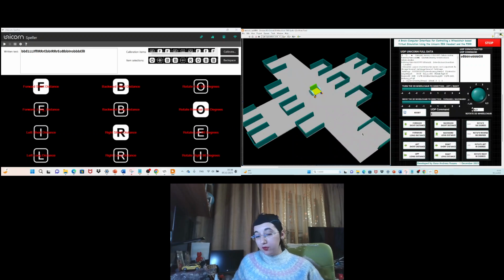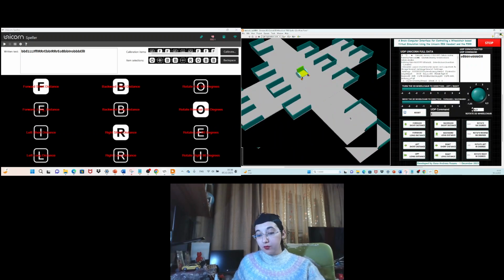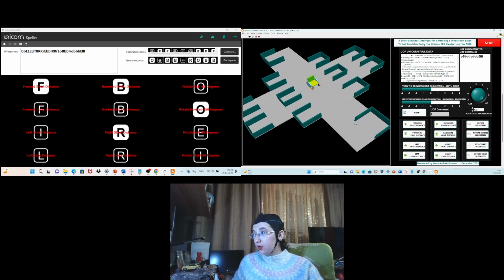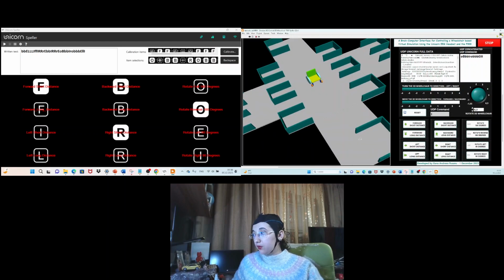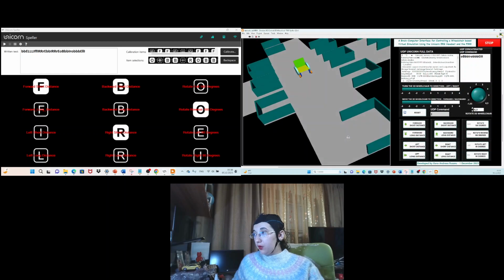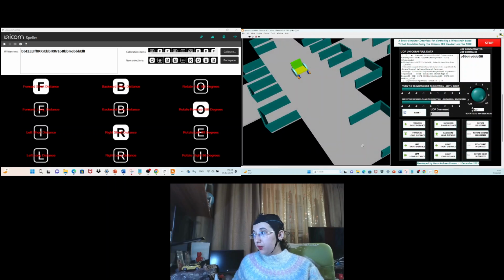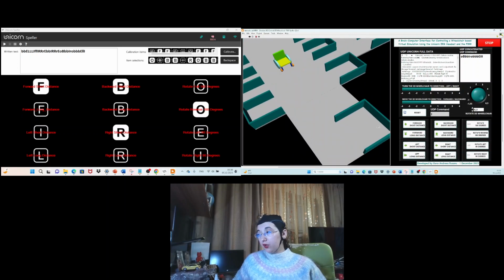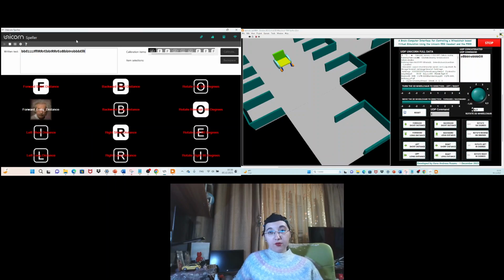And here you will see the wheelchair. So I will start the LabVIEW application, and now you will see that the wheelchair will be controlled so that it will reach this location for the 11th experiment. Let's begin. So the first one is forward long distance.